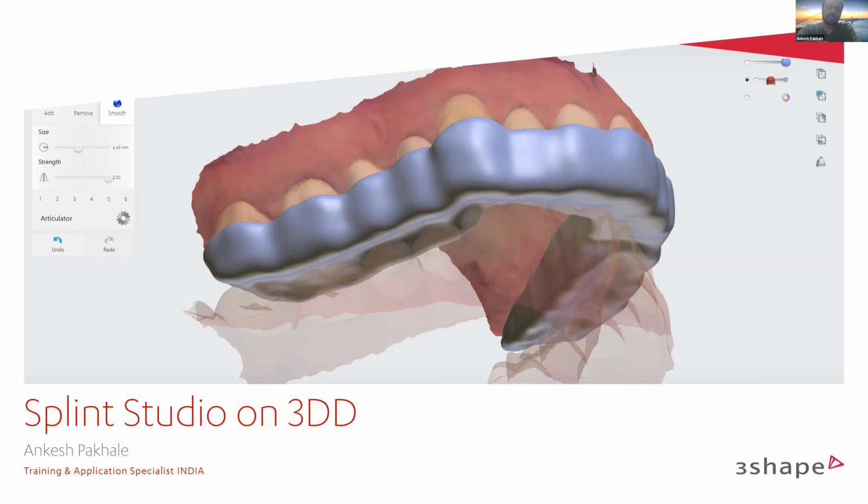All right, now we are going to start. Right now I'm going to show you something from the slides in the PDF, and then I'm going straight to the software. There, I'm going to explain how you can scan from the lab scanner and activate, or if you want to use it from the dental desktop, how you can use it. So yes, all that can be used.